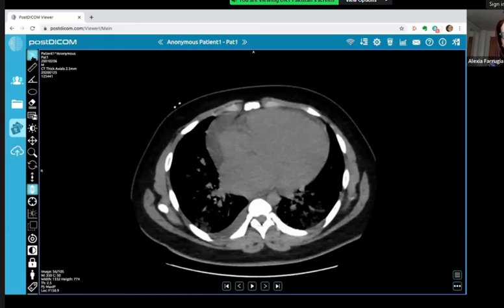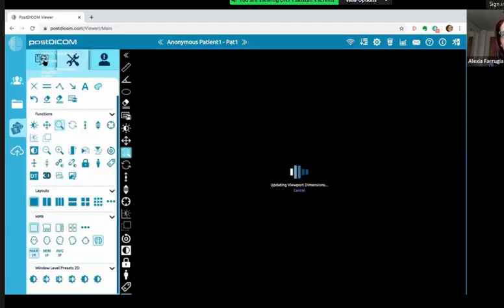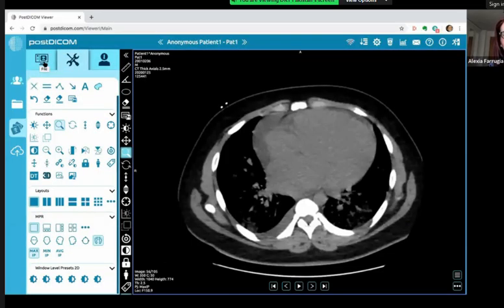So this patient had an echo and he was found to have a decreased ejection fraction of less than 40%. Don't forget, he's a 19-year-old. This was dilated cardiomyopathy in a patient who presented with pulmonary edema. So the diagnosis was made on echo and on CMR.